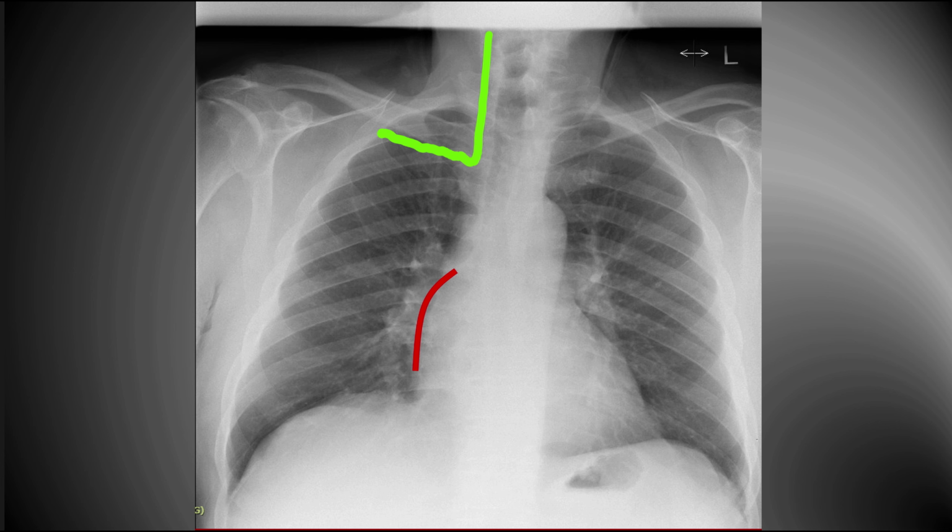In this situation, if you see this picture, the line is malplaced. This is an attempted right internal jugular vein line, but what has happened, instead of it going downwards to the junction of the right atrium and the SVC, it has turned rightwards and gone down the subclavian vein towards the arm. Occasionally it goes like this into a parallel vein that is not clearly heading towards the heart. This is the azygous vein that is sometimes seen in some patients.